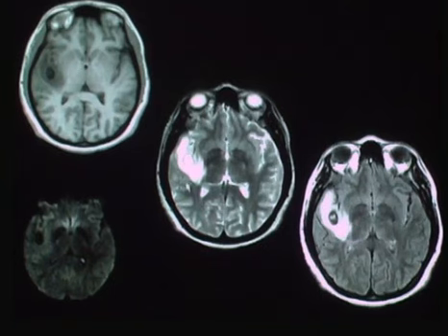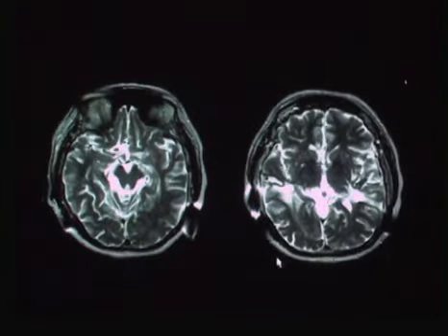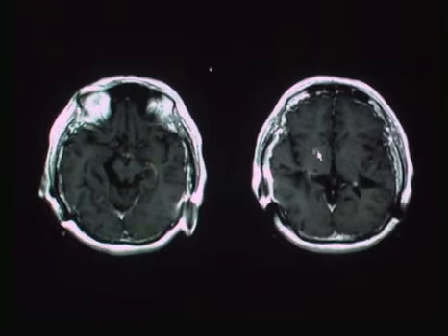Here's another example of a cystic lesion with a scolex in it, a nice associated inflammatory edema, and no restricted diffusion. And this is what we expect at the end stage, multiple parenchymal calcifications. Here we have gradient echo MRI to bring out the susceptibility artifact of a focal parenchymal calcification. And here's an example of a patient who had neurocysticercosis and ended up being shunt dependent because of multiple parenchymal and subarachnoid lesions and persistent distension of subarachnoid spaces, which ended up giving her hydrocephalus and shunt dependency. And here's an example of another ring-enhancing lesion, with a tiny little scolex we can see here.